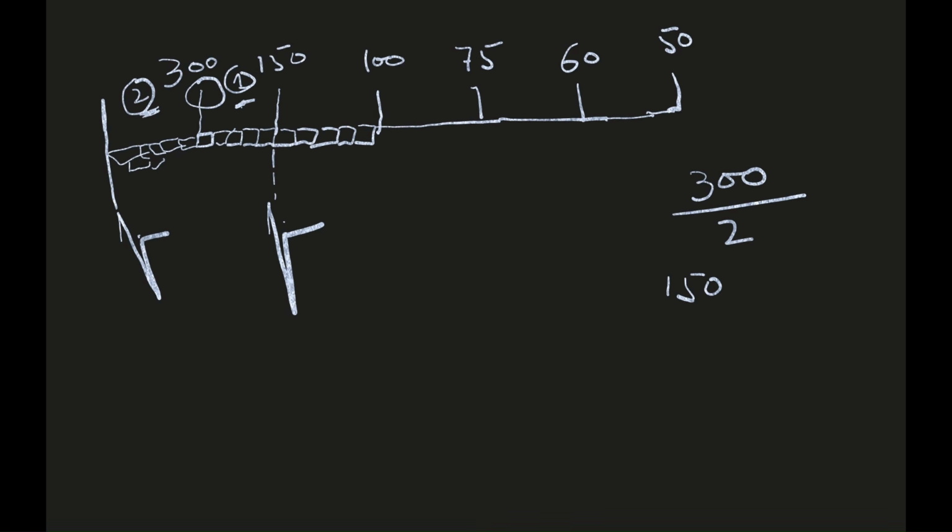But what if this is your reference QRS complex and your next QRS complex lies in between two milestones? Now, apply the method that I have previously told you. For example, it is lying over this area.